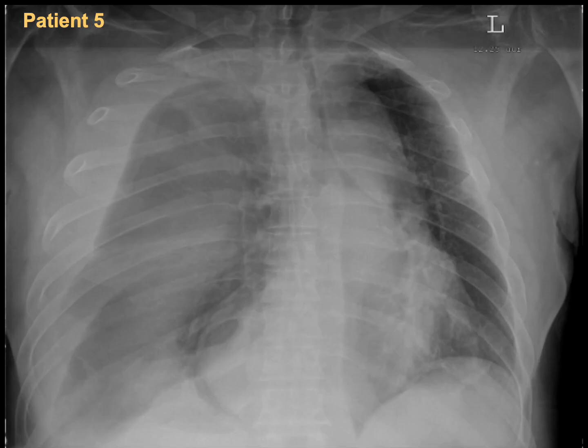Let's move on. This patient is 40 years old, respiratory distress after sustaining a gunshot wound. Again, go for the airway. I think all of us can appreciate that the airway, these are the spine, and this is the airway. It's very pushed to the left side. I think all of us can appreciate that. Okay, then the lung. Well, the lung here is not very clear, and this homogeneous whitish opacity is very similar to this one, so I will continue from here.